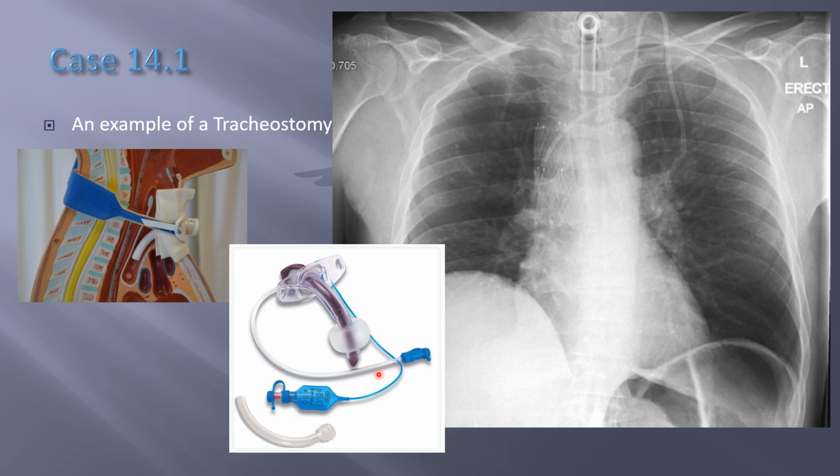This other catheter is more for secretion control. This is another tube that comes down the side, and any oral secretion that comes from above will collect here, and this hook does suction, and you can suction that out so it doesn't go into the trach. So once it's inserted, you pull this purple obturator out, and you put this inner cannula in, and it snaps in place, and that's what that is. So this is what it looks like. Again, the tip of that should be at the bottom of the clavicle heads, because this does come in different lengths. So you can see that.